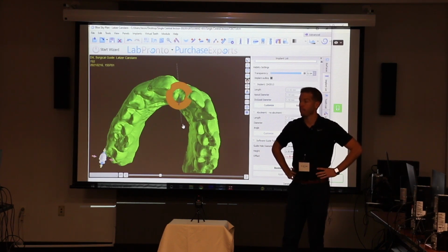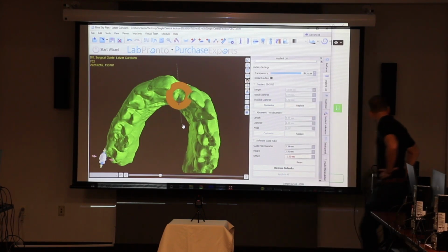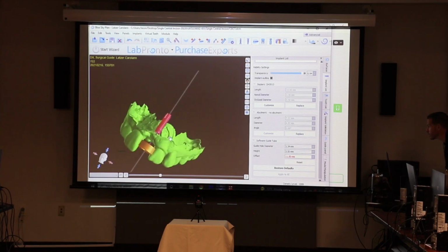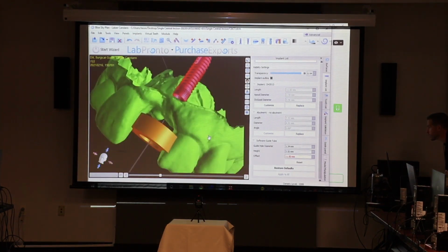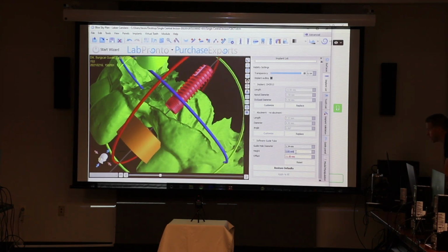When you first start doing that, you gotta make sure you think through it and even make some notes on that. Now when you spin that, spin it so you can see sideways, will it fill in underneath that? Yes. So the guide tube goes longer? Yes. It'll fill in down there? Yes. And the tube will extend down to the gums? It will. Good, okay, I always wondered about that. Yeah, it'll essentially increase the height. It'll do exactly what I'm doing right here, right?